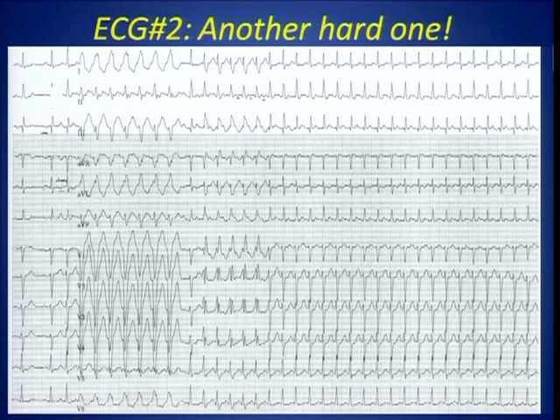It's not going to be ventricular tachycardia. There's also a narrow QRS. So, you know, it certainly makes you wonder. So let's have a look.